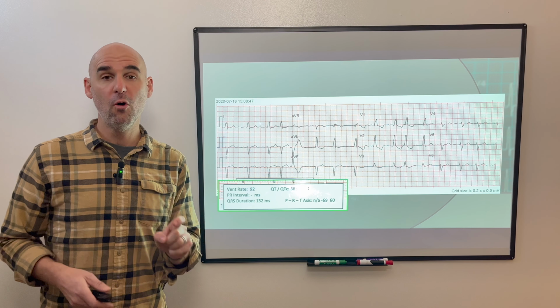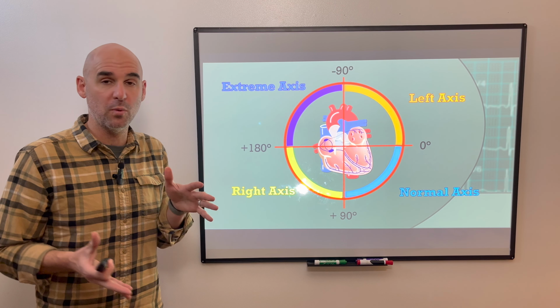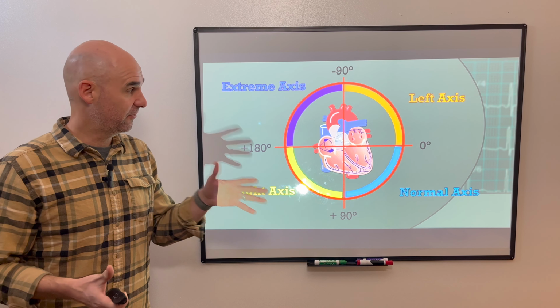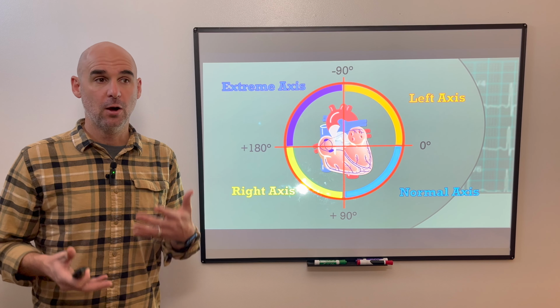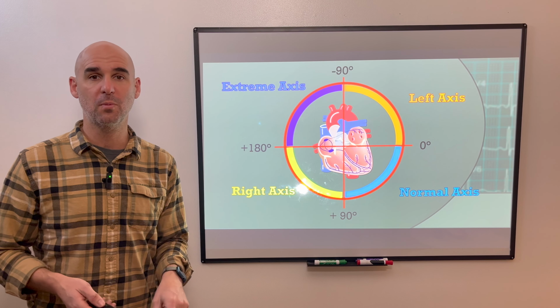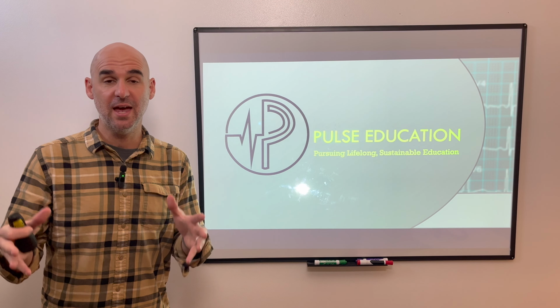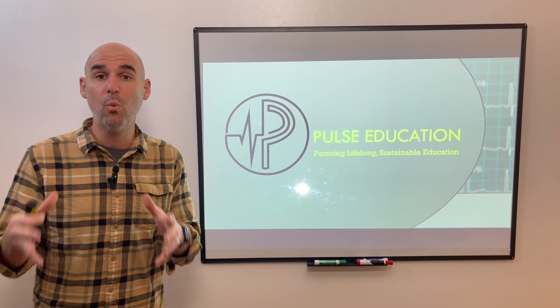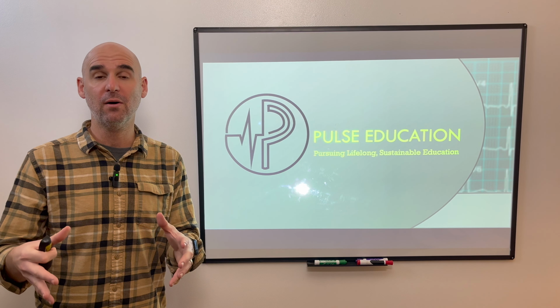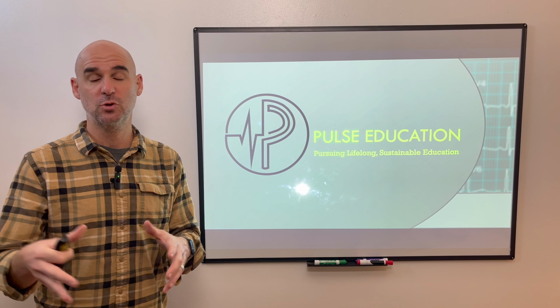All right, hopefully this makes sense. You've got a little bit better indication at least of what we're talking about, the average direction of depolarization within the heart. And if it's between 0 degrees and 90 degrees, or leads 1, 2, and 3 are upright, that is normal axis. Conduction is working normally in the heart. Thanks for joining us this week. Again, this is video 1 of our axis determination, and we're going to go through this and make sure that you guys know it really well, and that you're going to be really confident in applying axis determination on 12 leads in the future.